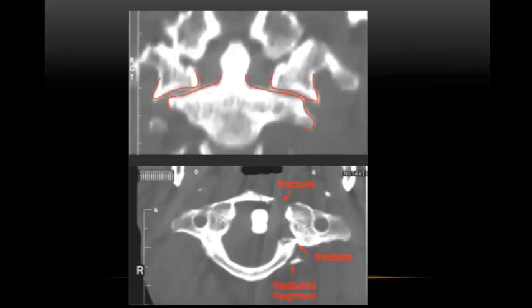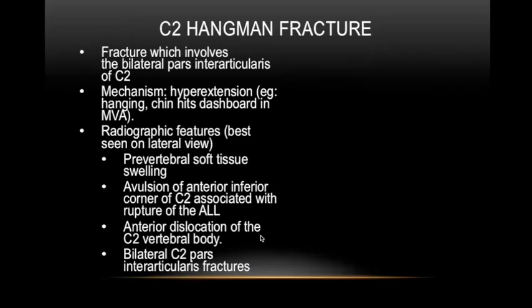Okay, this is on CT. It doesn't matter where it fractures, as long as the bony ring, front and back, is involved. CT is indicative or required to see the extent of the fracture and the presence of bony fracture within the spinal canal. All right.